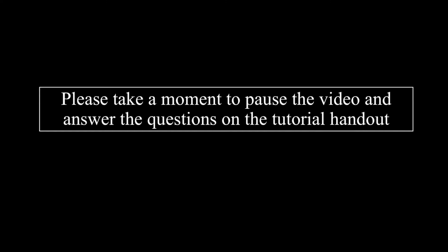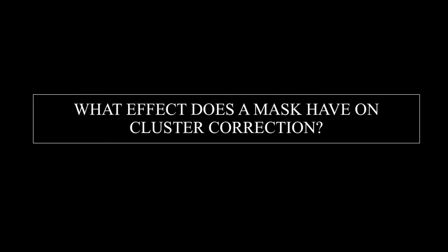Question 6. What happens if we change the p-value? What strategies can we implement to prevent p-hacking? Now, let us take a look at the effect a mask has on the cluster correction.